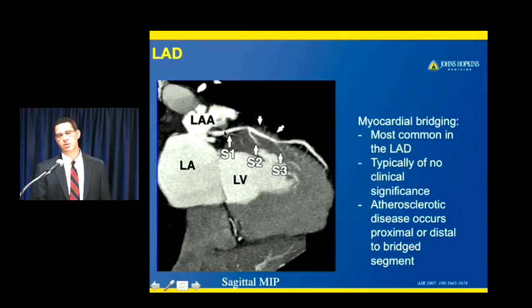So the coronary artery actually is traveling, instead of on the epicardium surrounded by fat, it now dives into the myocardium here and is surrounded by muscle. And then later on it pokes back out again, back into the epicardium surrounded by fat again. So you can recognize this by the change from epicardial fat to muscle surrounding the coronary. What is the significance? Really no significance at all. In the vast majority of people, we see these incidentally, and they're really not of any importance.